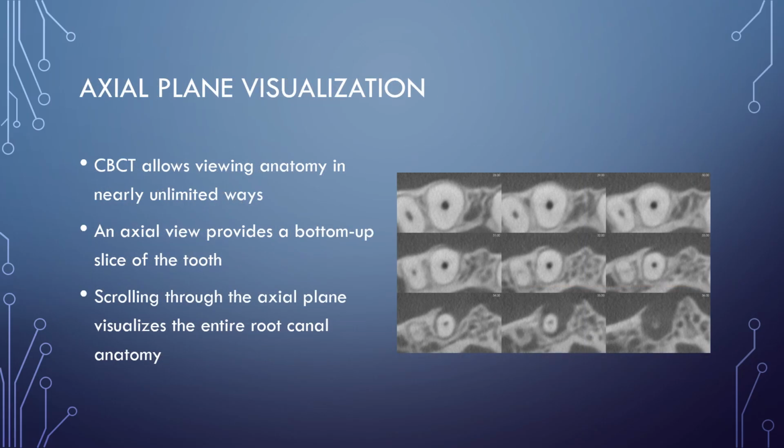The true power of Cone Beam Computed Tomography lies in its software, which gives us the ability to view dental anatomy in nearly unlimited ways.